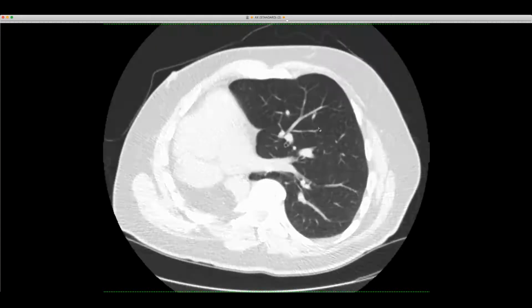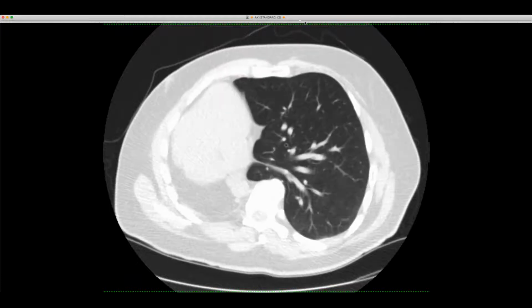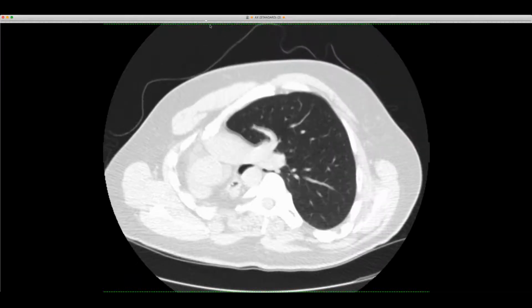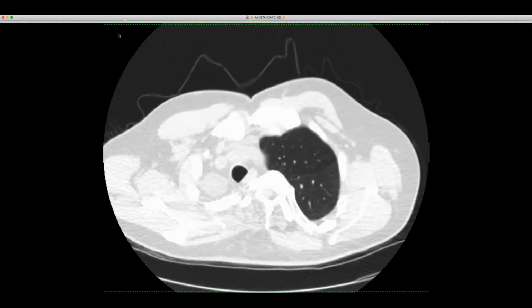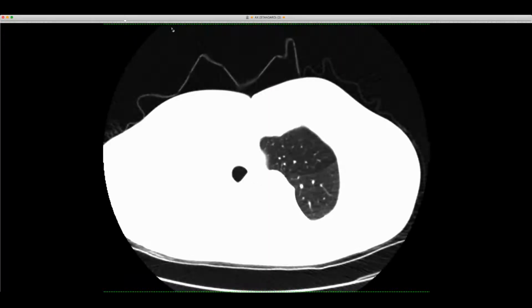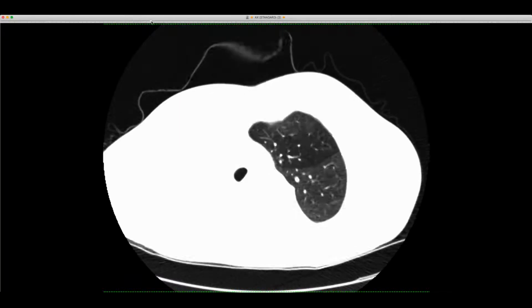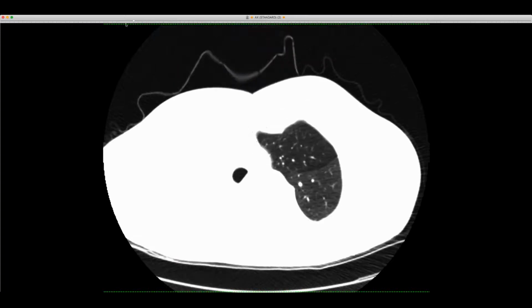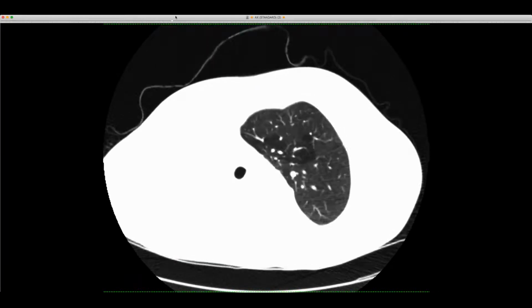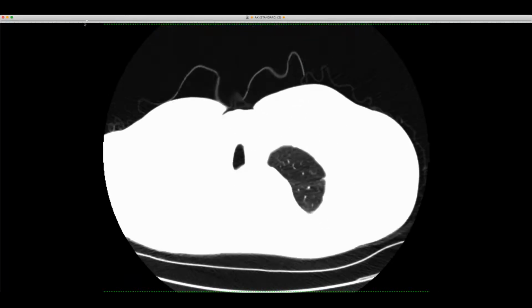So it's unusual to develop malacia or narrowing like you get with post-pneumonectomy syndrome. You wonder if there may be some air trapping there, but it may not be physiologic, because if you look at the caliber of the vessels in the darker lung, they're not particularly small, suggesting there's not hypoxia and vasoconstriction. So they might have compensated for that over time. That's my guess.